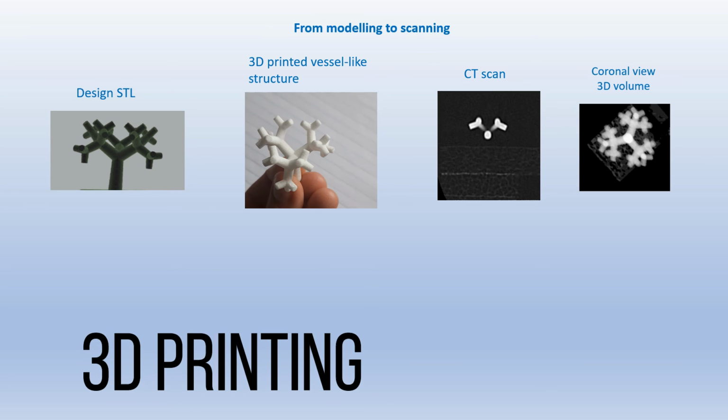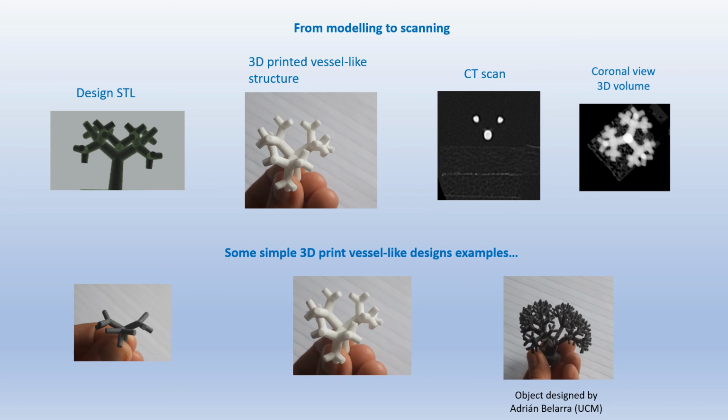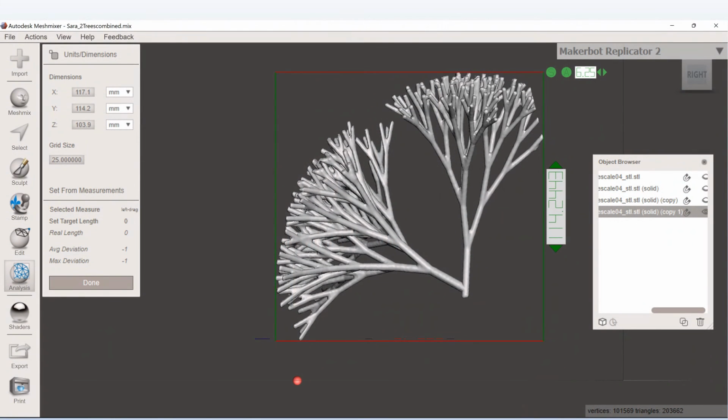The software output can be manufactured into small phantoms with your printer and material of choice. Afterwards, you can check the printing process, measuring the phantom directly with a caliper or on the images, also for attenuation checks. You can combine several small vessel models by post-processing to create bigger and more complex phantoms too.